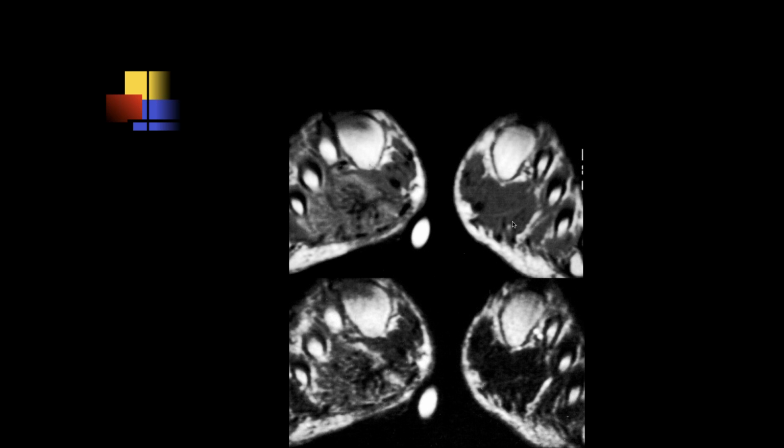Okay, so it's heterogeneous and there's this low signal intensity. This is PD, this is T2. Yes, PD and T2. On the T2, I don't really see much fluid signal intensity. It does look the same signal intensity as the adjacent musculature or soft tissue. And this patient does have a draining sinus, and there are these little yellowish granules that come out of it. A lot of people call them sulfur granules.